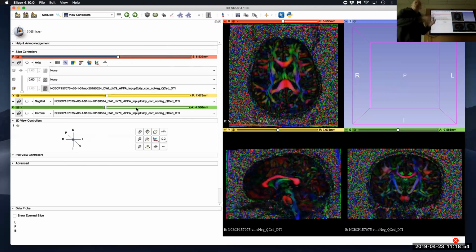And so what I would do now as a final step is this investigative tractography. I can quickly show you how that's done. This is the marker in 3D Slicer where you would place landmarks. Now you place landmarks where you would expect the major tracts to go through. There are probably other tracts to go through there as well, so you're not just getting those tracts, but a little bit more. But the main thing is just that you can see at least those major tracts.